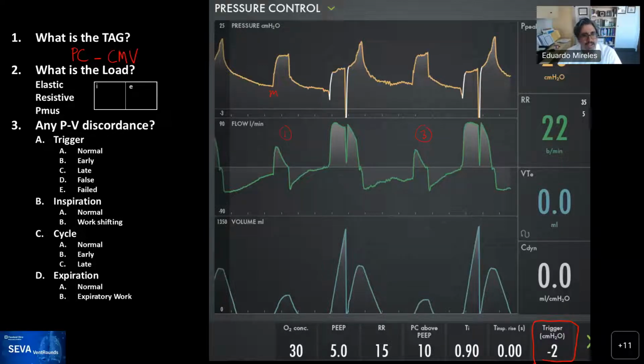And finally, the last item is the targeting scheme. Sometimes when you see only one breath sequence, it's hard to ascertain what is the targeting scheme, meaning how is the ventilator programmed to control and interact with the patient. And what we can see on this breath sequence is that the patient is getting a mandatory breath, and then the patient does an effort and double triggers the breath. And actually, the pressure looks lower than that set on the prior breath, and this is probably because of the effort that the patient is doing.